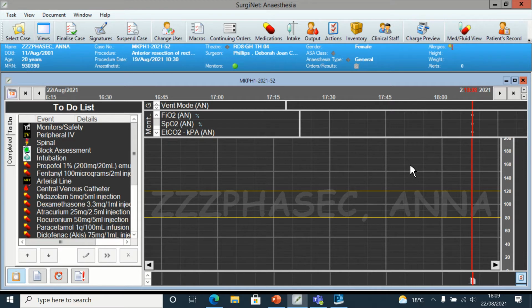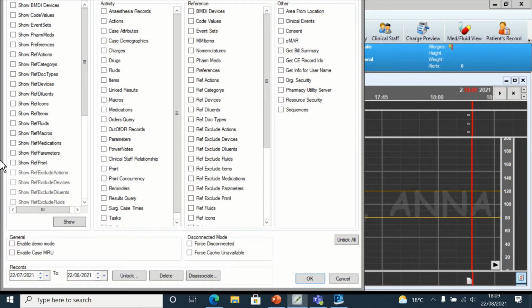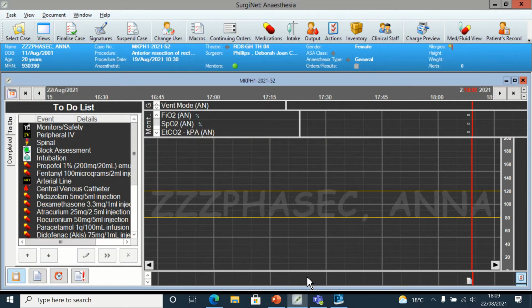These are kind of fake numbers. Just make sure that the fake number setting has been switched on. This is something you won't have to do. It's just to make it look a bit more realistic.